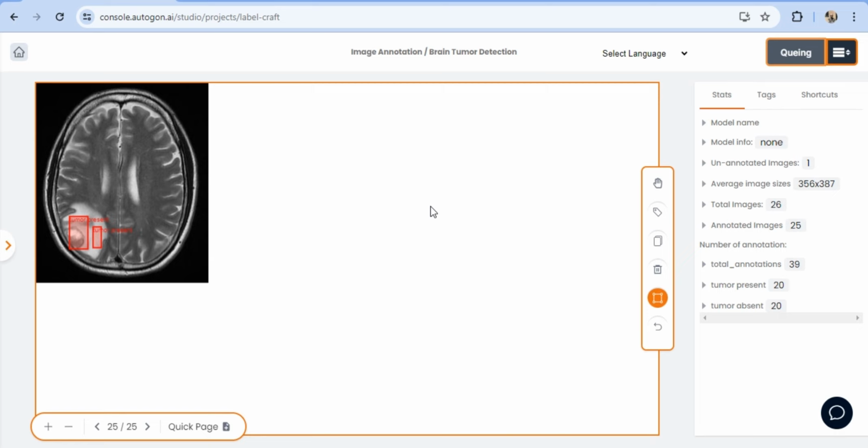So we're going to queue for a bit, and in some minutes we're going to change this queuing to train, and from there we're going to see how long it's going to take us to train this model, right? And like I mentioned earlier, when you're adjusting your epoch level, you want to be very careful. The idea of epoch level basically is trying to check for more distinctive patterns in what you're trying to detect exactly.